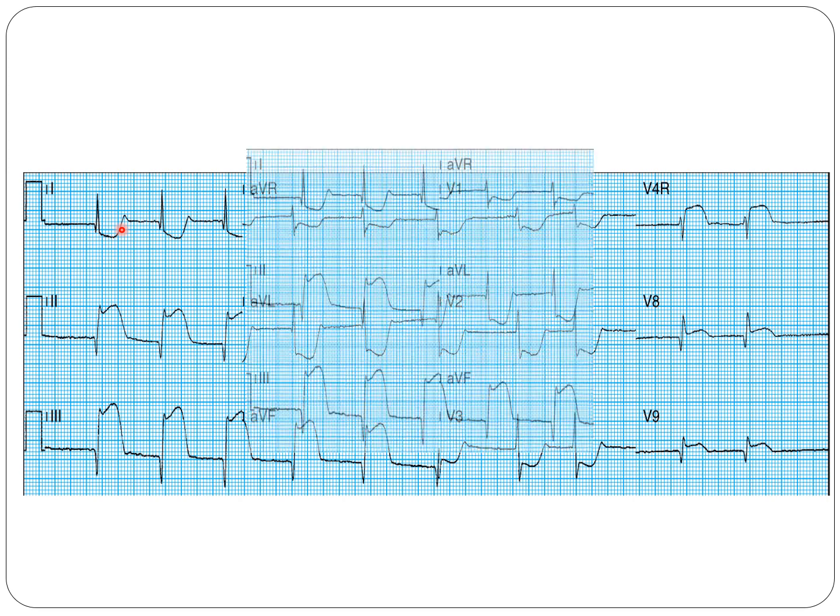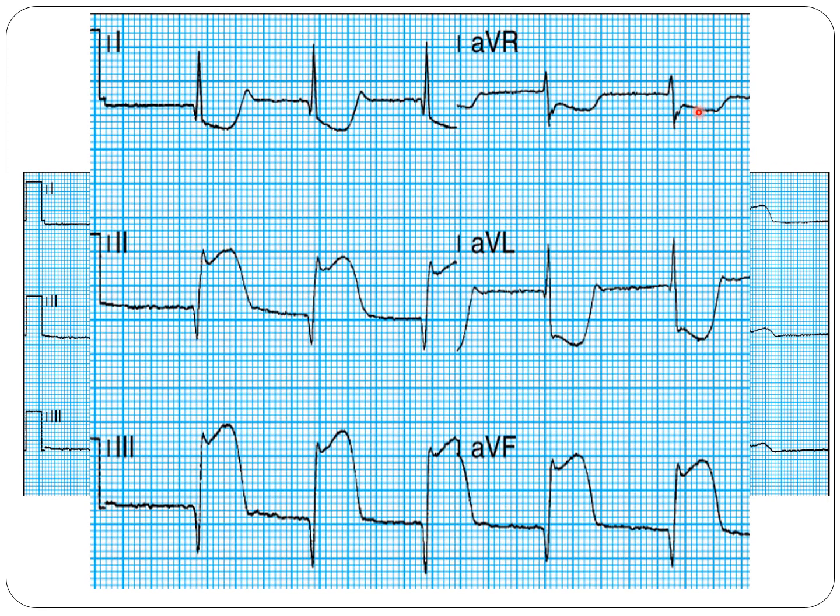Let's see. First of all, we have rhythmicity. I cannot see any P wave. The heart rate is 1, 2, 3, 1, 2, 1, 2, 3, 4, so 75. There is no P wave. I cannot see any. However, the QRS is narrow, so it has to be a junctional escape rhythm or junctional acceleration, because this is faster than a junctional rate.